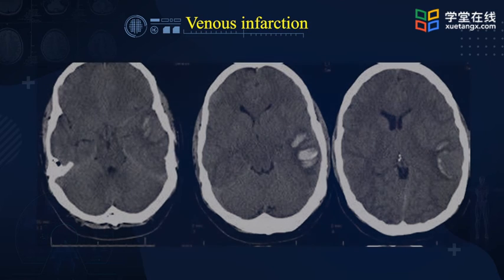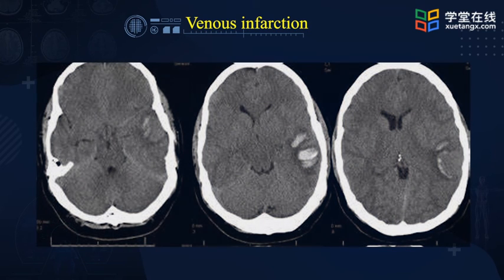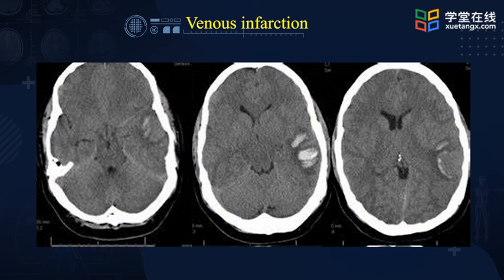This is a typical venous infarction due to a thrombosis of the left labbé vein. The CT images demonstrate hypodensity in the white matter and less pronounced in the gray matter of the left temporal lobe. That is a broad differential diagnosis, including arterial infarction, infection, tumor, etc. Notice that there is a dense clot sign in the labbé vein.